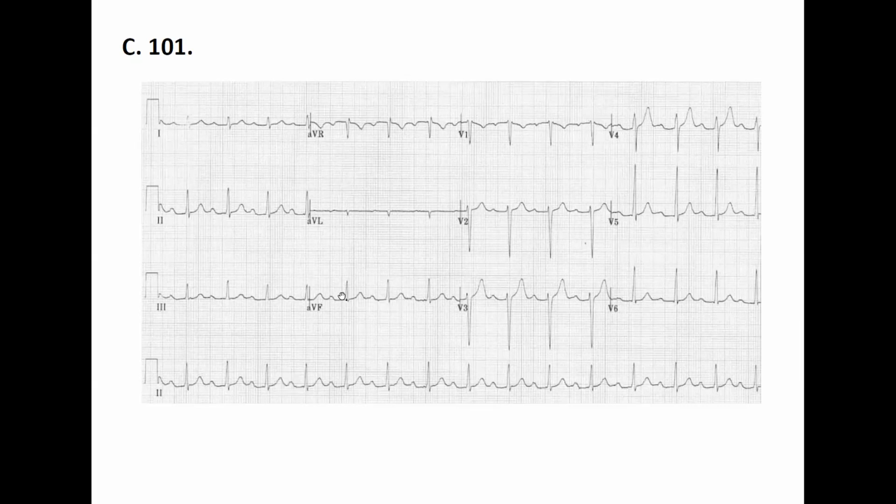Okay. Now let's go, and I'm sharing this one, as you see. Now let's evaluate it. Which is the first thing that we have to do? The rhythmicity. Is it rhythmic? It is. Good. Next one, heart rate. There's 1 QRS every 3 squares, so it's approximately 100 BPM. A little bit less, because it's more than three squares. Fine. So it's normal.